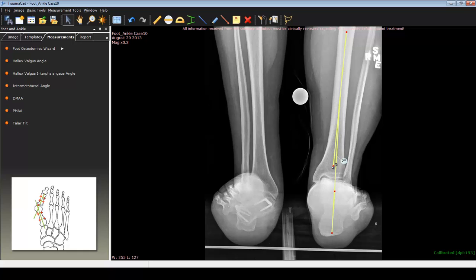And in this patient, there is minimal to no deformity of the hindfoot. In the frontal plane, there is barely 2 degrees of valgus, which is very normal. If you extend this down, there's another measurement that is very important when assessing the Saltzman view. Normally, the calcaneus has a relationship with respect to the tibia, and that can be measured. In normal patients, that measurement is anywhere from 0.5 centimeter to 1.5 centimeters. In this patient, the right side, which is the normal side, measures 1 centimeter, so it is completely normal.